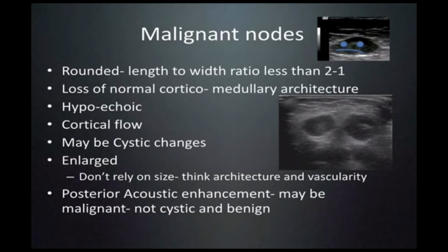And also don't be fooled by posterior acoustic enhancement. Oftentimes when we see that posterior acoustic enhancement, it's a sign that the lymph node is benign. But there are lymph nodes that are malignant and have posterior acoustic enhancement, primarily lymphomas and melanomas.